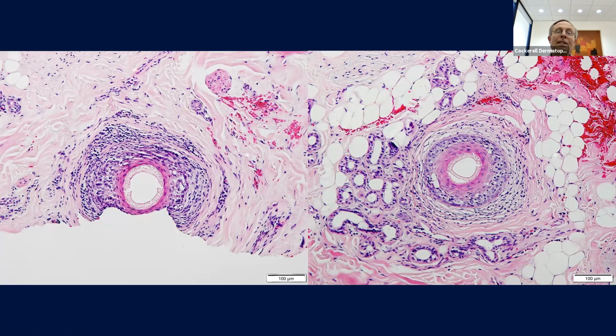You know, traction is death by piano wire. It's slow, gradual strangulation of the hair follicles. And you gradually build up this pink eosinophilic collagen that just chokes off the follicle. So that would be the last of the 3. I wouldn't like that one as much, but nothing else will do it.